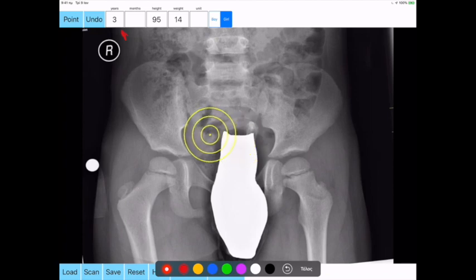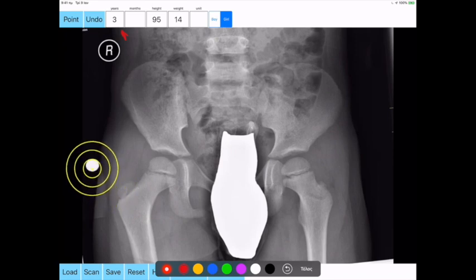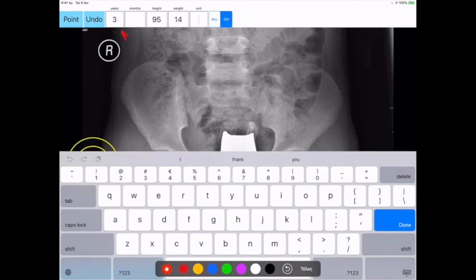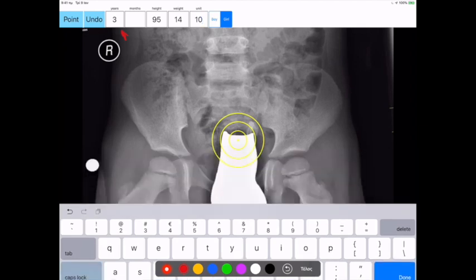Next you have to fill the calibration unit box in mm after finishing the calibration procedure. With the calibration procedure you try to locate the center of a template, a known dimension object in X-ray, for example a coin, by moving the transparent circular yellow template over the object, coin, trying to fit a best fit circle to the contour of the coin circumference. Once you have found the best fit, by clicking the point button, the center of the coin is marked C1.